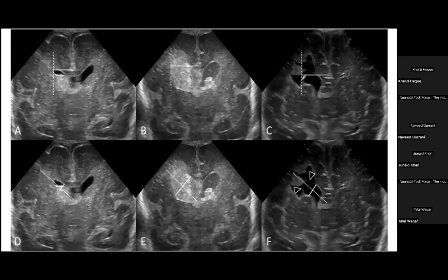And here, these are some porencephalic cysts which coalesce with the lateral ventricle, and how difficult it is to measure the lateral boundary. But this is just like an imaginary line. And similarly here, when the hemorrhage is there, you just see the extent and measure the anterior horn width.